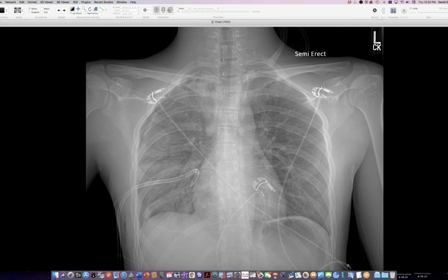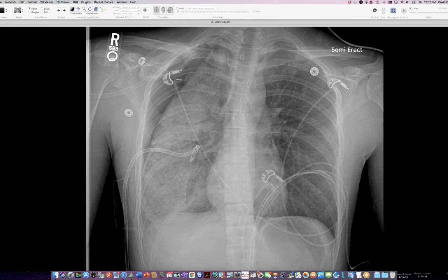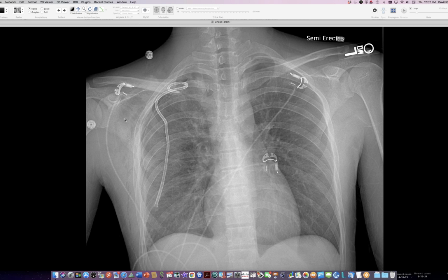But instead, things got much denser. So here's just a few hours later, you can see that the abnormality of the right lung is getting worse, not going away. And the next day or later on, it's even worse. And it started to decrease after a few days. And the current radiograph is here. You can see that it's all pretty much gone now, so it's faded. So this is an example of re-expansion edema, which is really a kind of alveolar damage.